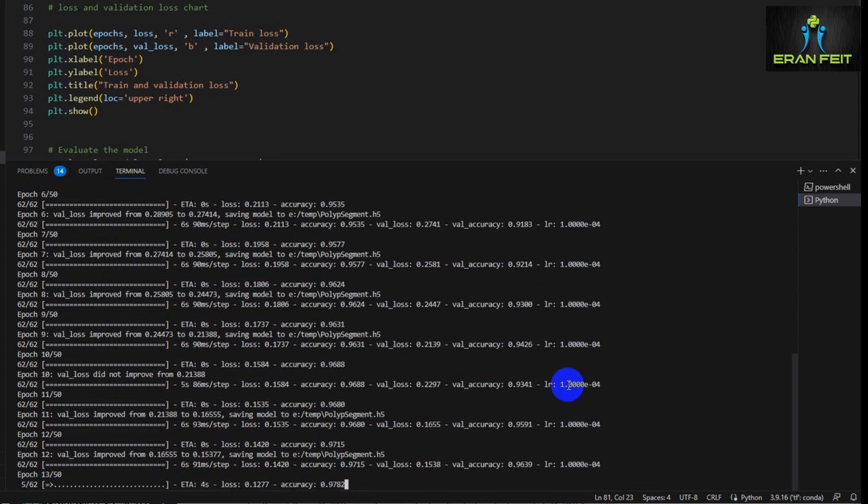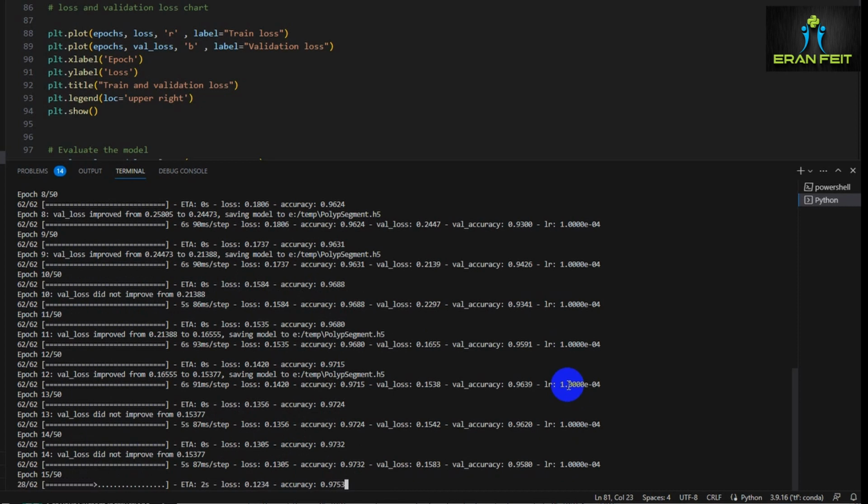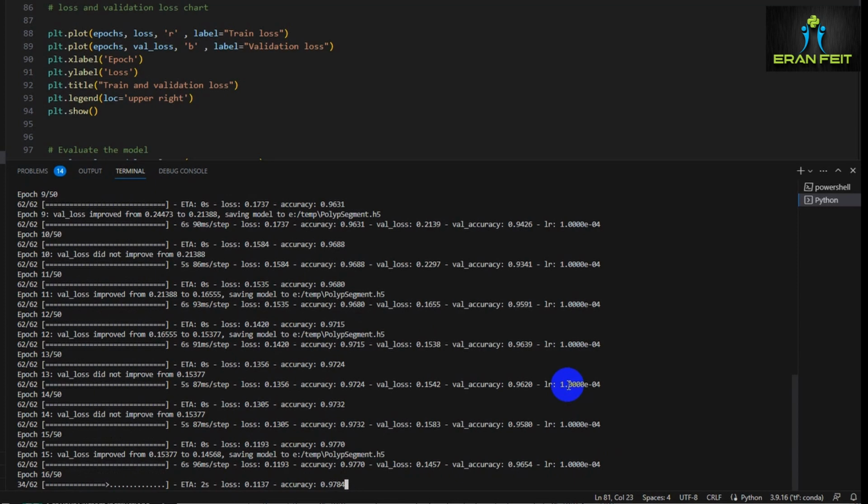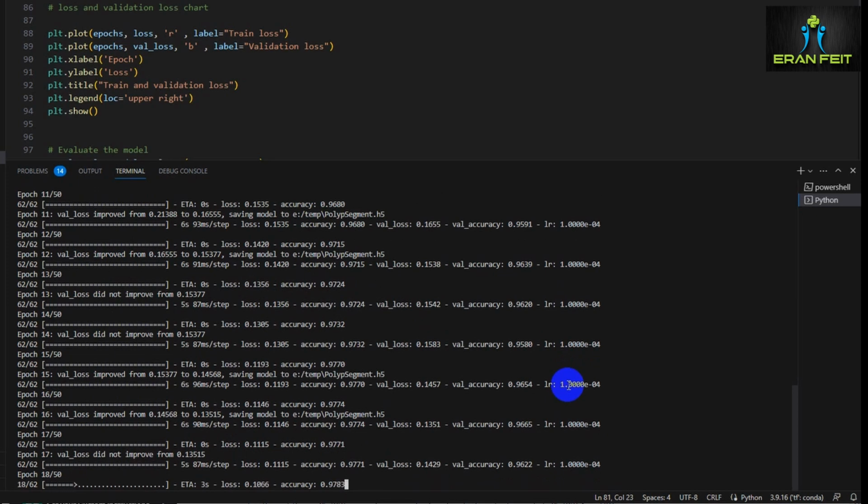That means that our training is very good and it's improving during the training process. 15 epochs, 16 epochs. Okay, let's wait for the end. I can see that it will take a few more seconds.